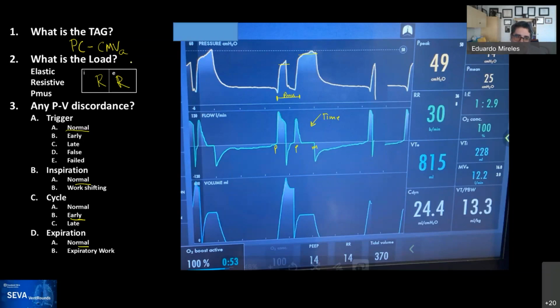When you are on an adaptive mode, as you recognized, if the total volume that the patient gets is 1.5 times the size of the breath, the machine will cycle the breath, and that's what you saw there. It's cycled based on volume, so it's a machine cycled breath, not a patient cycled breath.